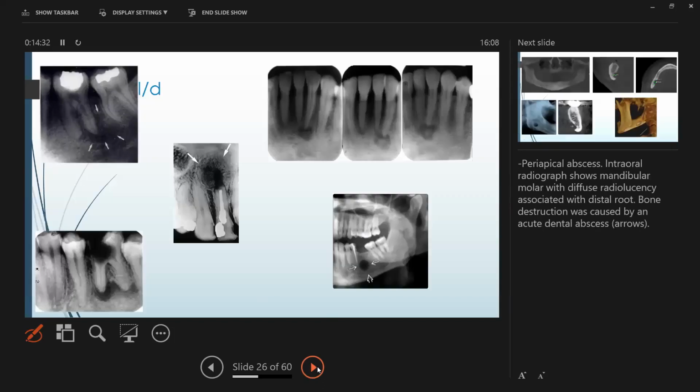Yeah, I was speaking about the differential diagnosis. So who can tell me what are these? Because I have not named it, because once naming it, it's not going to be of any benefit. Yes. So this is also like a periapical radiolucency, but it's not as defined, right? It's not as defined, but this is well defined, but it lacks a cortical border. This has an endodontic treatment in it, and it shows some kind of spiky bone forming.